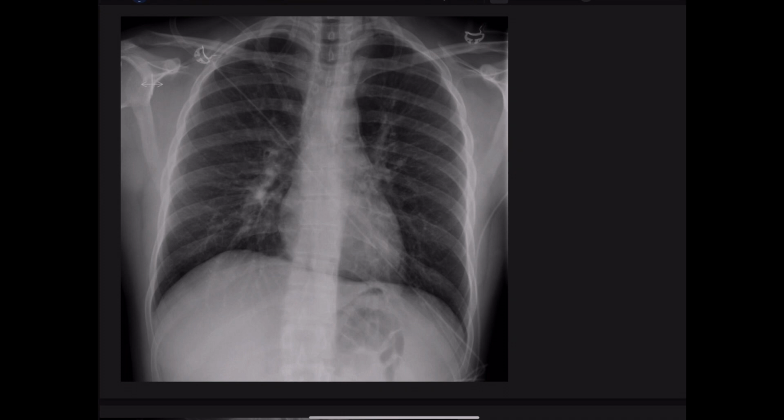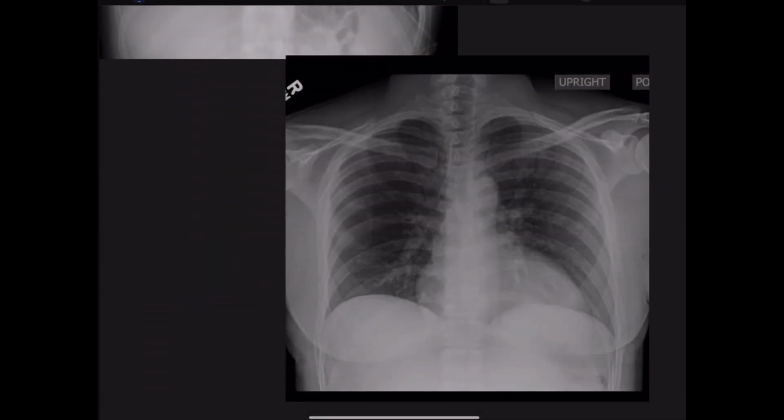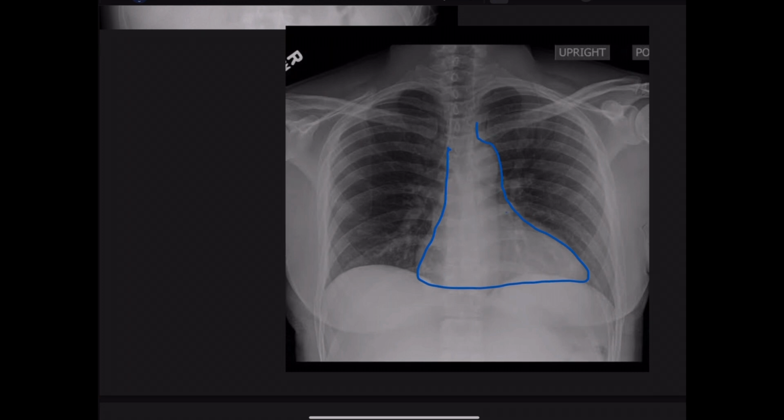First compare it with the normal chest X-ray. There is a normal chest X-ray, and this is the mediastinum part of the chest X-ray. We will see that this part is opaque and there is no lucency in this area, because this is the heart, it is full of blood, and blood in the X-ray is opaque.